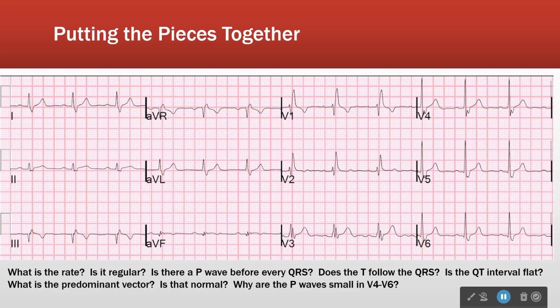What do you think? Yeah, close enough. Remember, it's never perfect. We're not computers. We don't run on a clock, okay? So as we breathe, as we move around, as entropy happens, you're going to have subtle variations. That's not what we're talking about by an arrhythmia. In arrhythmia, you have significant variations in how far apart the beats are.